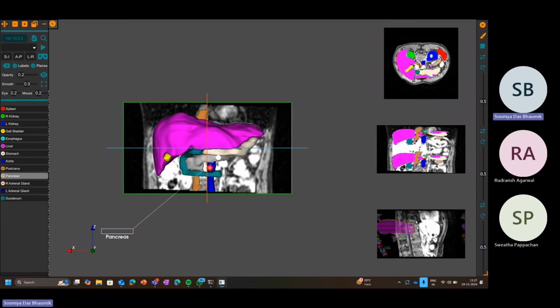The labeling has to improve as in what it's pointing to. What I point to and what it picks up is different. Okay, got it. Cool.